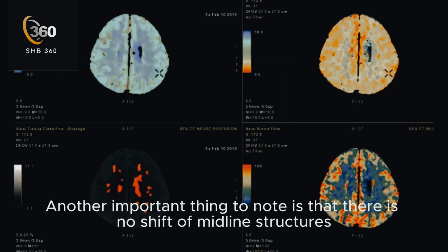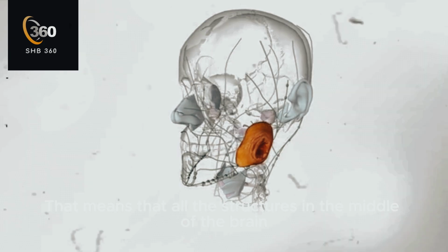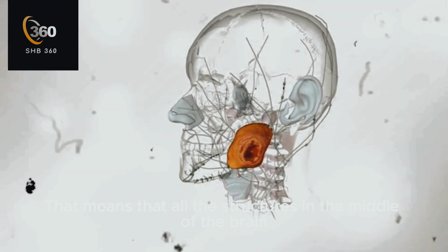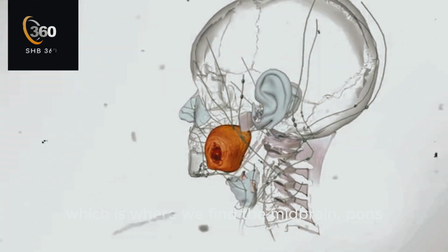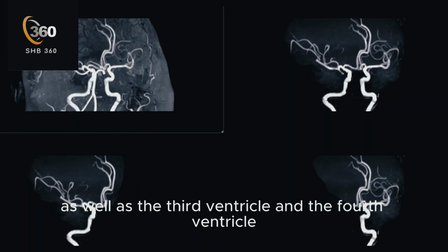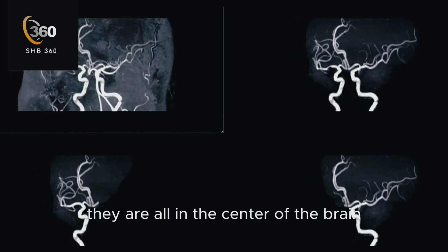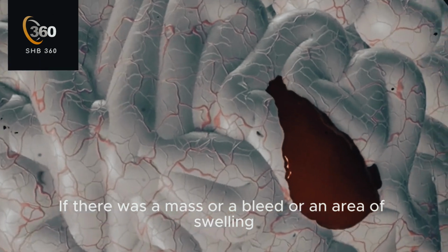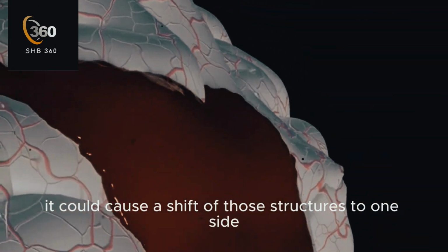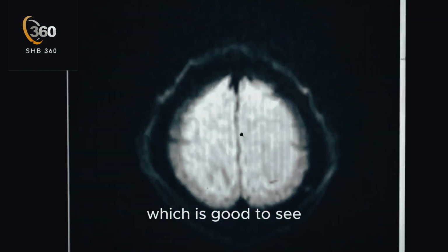Another important thing to note is that there is no shift of midline structures. That means that all the structures in the middle of the brain, including the brainstem, which is where we find the midbrain, pons and medulla, as well as the third ventricle and the fourth ventricle, are all in the center of the brain. If there was a mass or a bleed or an area of swelling, it could cause a shift of those structures to one side. And we don't see that here, which is good to see.